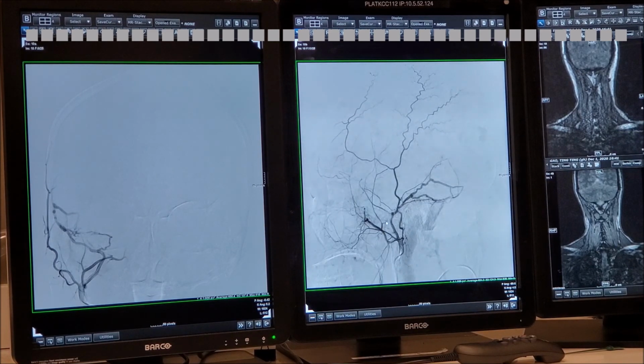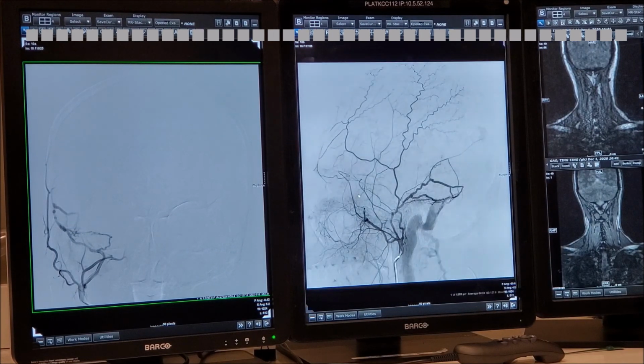I think this is foramen. Here's foramen spinosum. This is definitely a meningeal branch, so I'm tracing it backwards. This is where the mid-deep temporal would be. Here, the dominance is the anterior deep temporal to the temporalis muscle. I cannot tell you exactly what it is, but this definitely is middle meningeal, so I have to think a foramen ovale for this vessel to enter the base of the skull. Are you together? I see something here that is fishy, but we'll analyze it later.